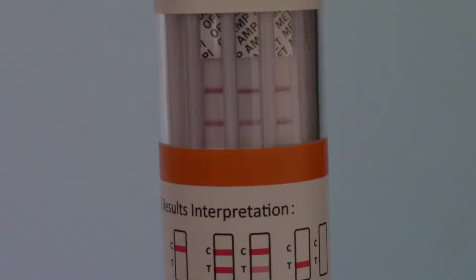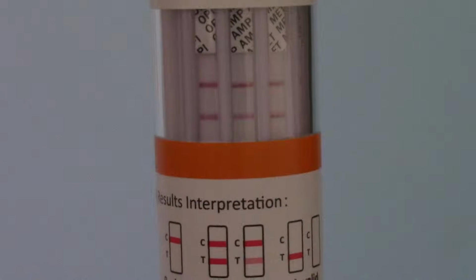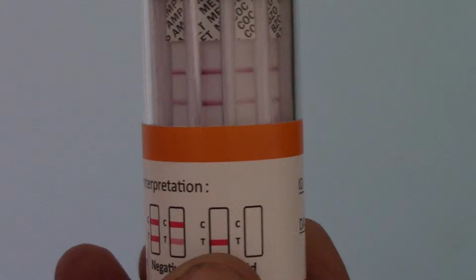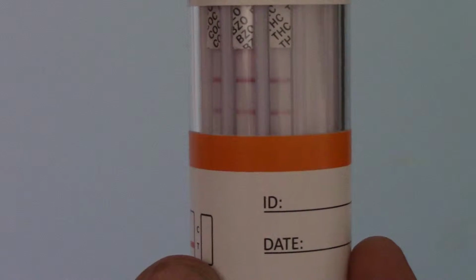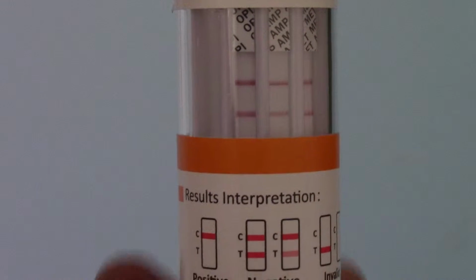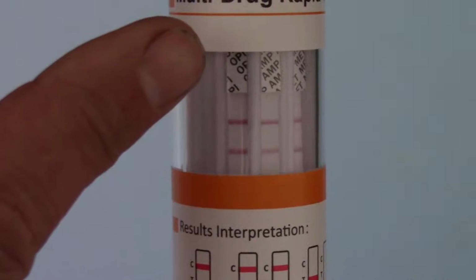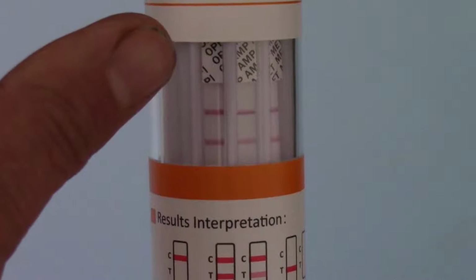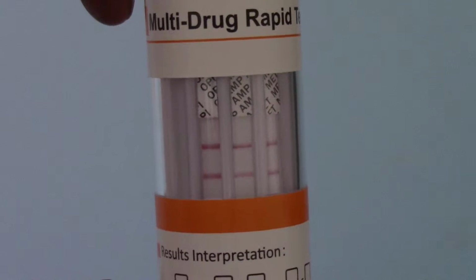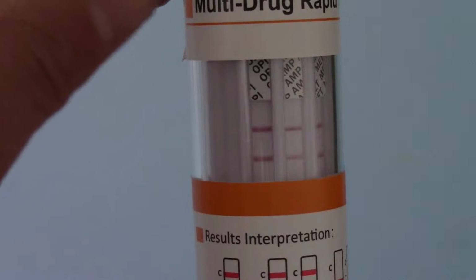Okay, well, welcome back to the final part of this product demo for the ALLTEST DSD-867 line. What we're showing you here is the results that we've obtained on these 6 drug groups in this 6-panel or 6-drug saliva drug test. Now, you'll see the abbreviations in this window at the top of the membranes. The coding for this will be on the cartons and in the instructions that you've received. The coding will vary depending on the combination of drugs you've selected and purchased on your test kits. But on this window, for instance, we have OPI for opiates.